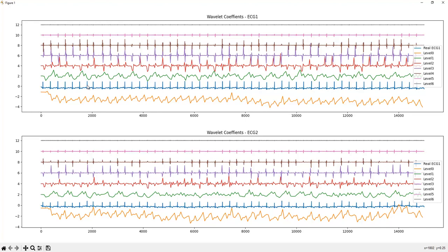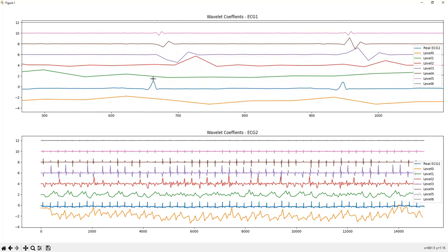Yes, yes. All the wavelet coefficients can be collected, summed, in order to create the real ECG signal. Okay? But in the instantaneous frequency characteristics, like this one, just look at this pattern in here. Firstly, this is the QRS signal in here. But in the QRS signal, we have some deviation in here with the higher components.